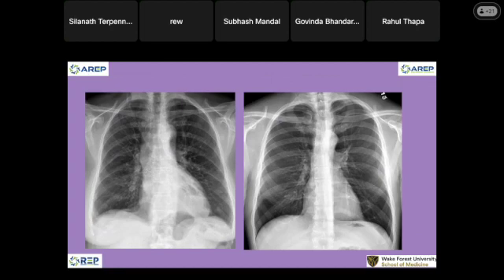All right, now I'm gonna go to the next case. Is it too difficult here? I don't know what to prepare, but I think this is the thing that we see every day. Tell me, is it too difficult so we can tone it down? Or are they too easy? We can tone it up too. Do they look alike?